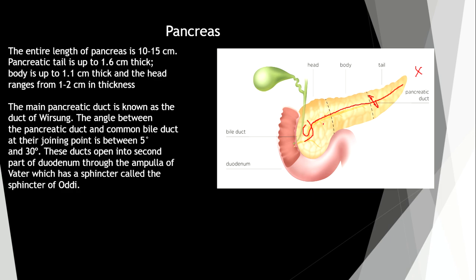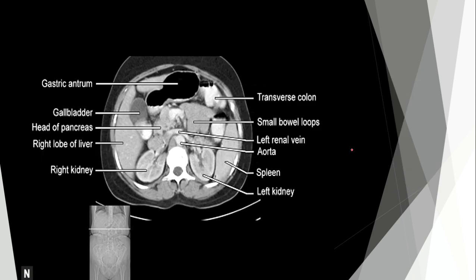And you must understand, we don't have a real anatomical division between the parts of our pancreas. You must scroll through some slices to see it. As we see here, we see only the head of the pancreas.